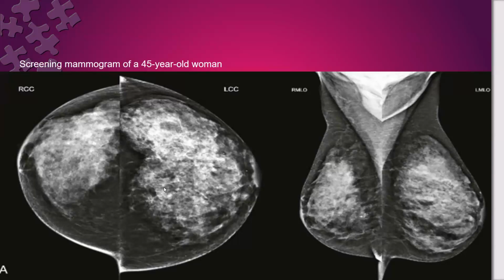Excellent, the right upper outer quadrant. Seen as what? Spiculated lines or no, or a concavity of the glandular tissue at the upper part, posterior. Just here, it is a bit retracted.